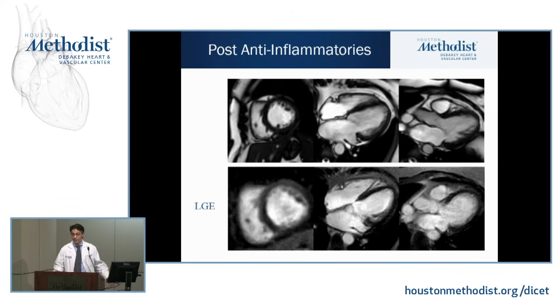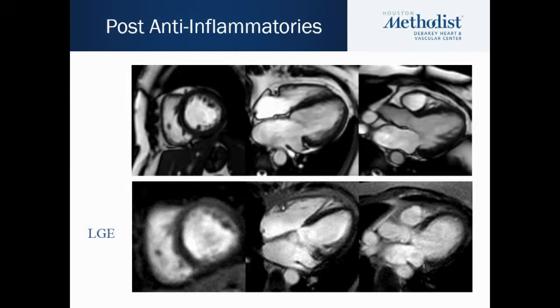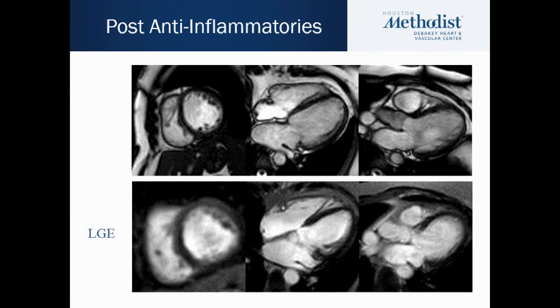Okay, and this was the same patient, same heart that I showed you, post-anti-inflammatory treatment. I hope you'll appreciate the pericardium now is completely thin. You don't see it, and there's no more of that bright white enhancement around the heart.